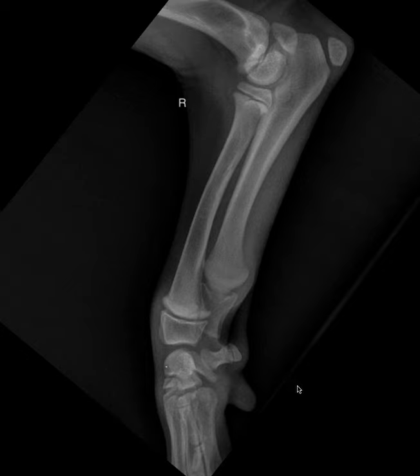Today we have a puppy. This 2-month-old German Shepherd puppy, who seems painful when handled, has come in for radiographs. The vet is unable to localize aside from maybe pain on elbow extension. So today we have a lateral view of the right, which I'm showing here, and in a moment I'll switch to the left.